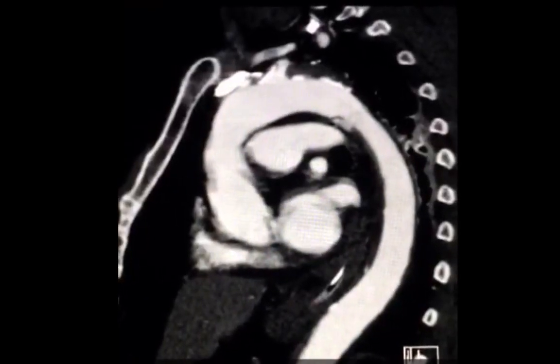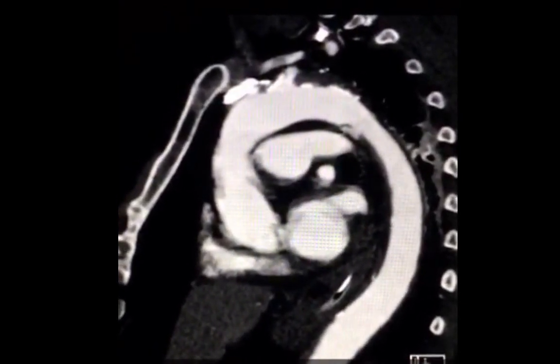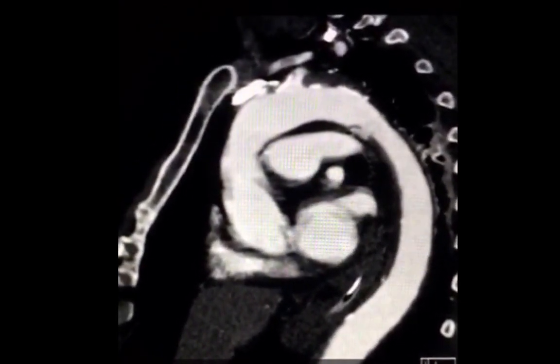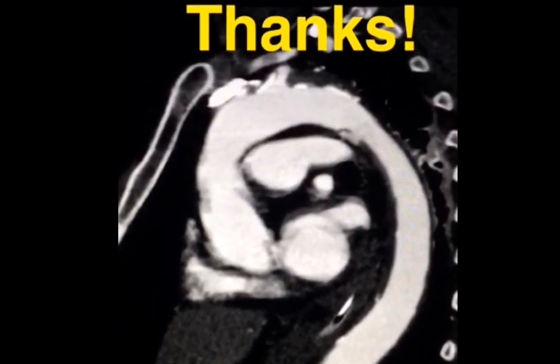Finally, acute aortic injuries are not dissections, and if they occur at any site of the aorta, they require immediate treatment. I will try to show more aortic pathology in future cases.